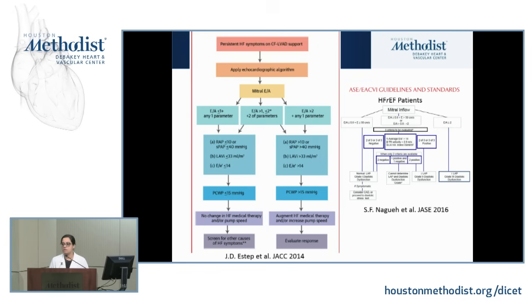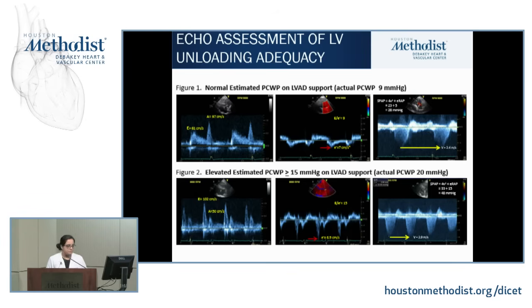effect of on the patient's hemodynamics, but we've seen that when that sets in and they have some kind of constrictive physiology or some restriction, they do not unload adequately or have more RV dysfunction also. And that's something that I want to look into further, so just try to get good tissue Dopplers and inflow velocities for us.